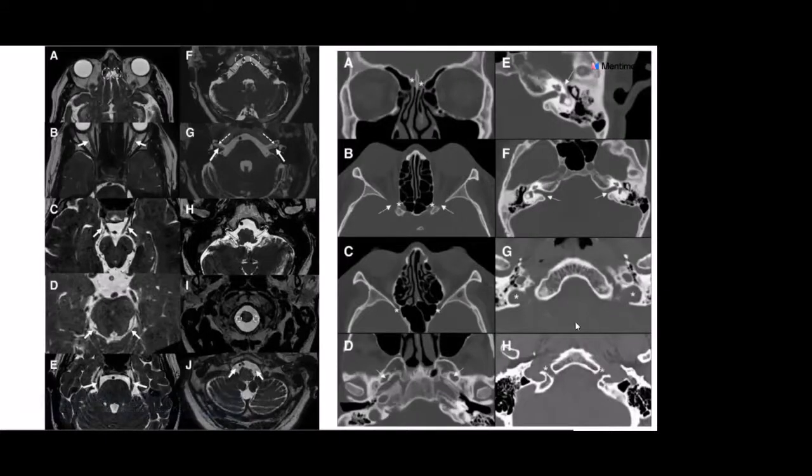Similarly, we talked about the CT scan. On CT scan, this is the cribriform plate. It's very important, not for the evaluation of the olfactory nerve, but you always have to see the cribriform plate in patients of trauma if they have a CSF leak. Second one was the optic nerve, so you should know where the optic canal is. And the superior orbital fissure, multiple cranial nerves use it as the exit foramen. Then the foramen ovale for the mandibular division of the trigeminal nerve is also very important.